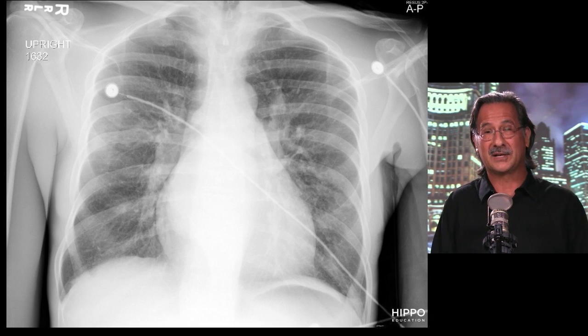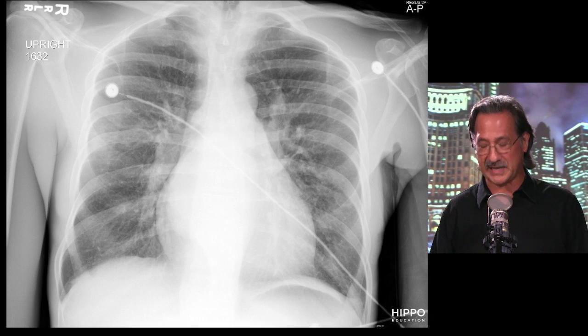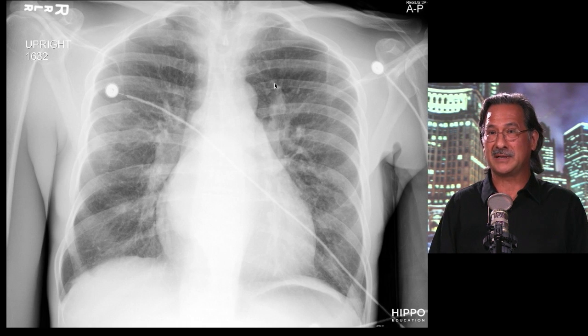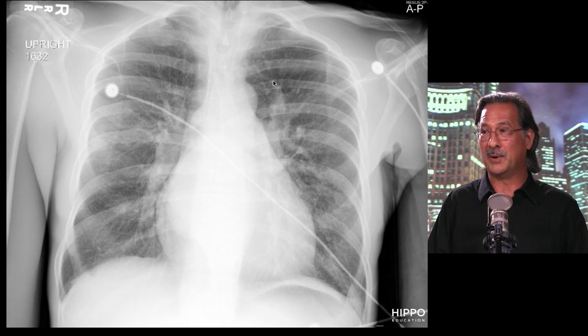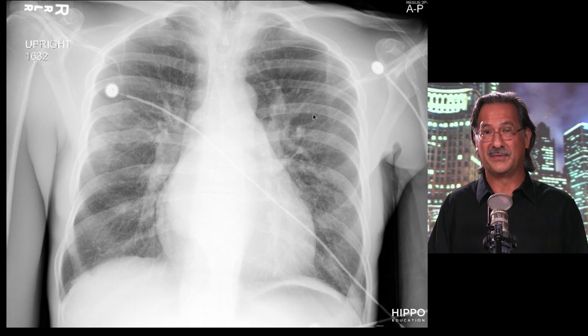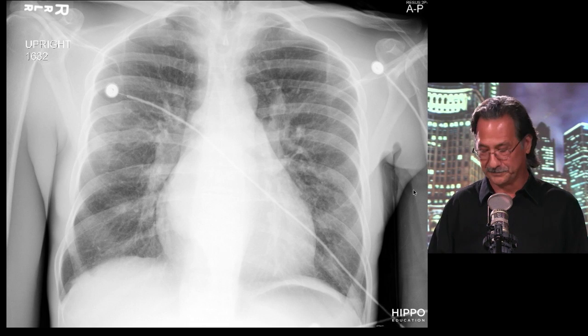We can also take a look at this chest X-ray, which shows you cephalization of the pulmonary vasculature. If we take a look up here, these vessels, just to be clear, are here normally, but we just see prominence of these in this particular circumstance because of changes in the Starling forces, or changes of pressures across the pulmonary circuit. So again, this is consistent with someone with heart failure. Yeah. The pump is not pumping hard enough, it backs up into the pulmonary vasculature, and you get cephalization because it's going to the head even though they're upright. Right. So we can see that as an index that there's something clearly wrong with that individual.